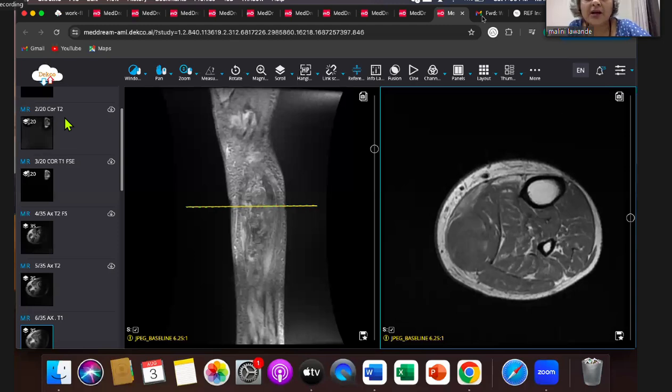Okay, so I think that was the last case. Let me answer questions. We can't diagnose the lesion. Yes, so if I'm not able to make out what the diagnosis is, I'll describe the whole lesion. I'll say the etiology is indeterminate and a biopsy is recommended.